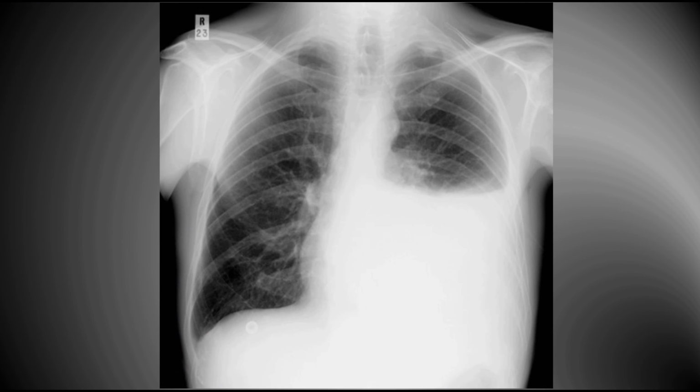What's going on in this particular picture? This is the typical appearance of a pleural effusion on chest x-ray. Typically, you see blunting of the costophrenic angle. You see a meniscus sign. That's curved lines that rise up the chest wall, creating a concave upward appearance. The opacity is homogeneous, and there is mediastinal shift away from the effusion. If you lie the patient on their side in the decubitus position, the fluid moves with gravity, and so it layers along the dependent area.